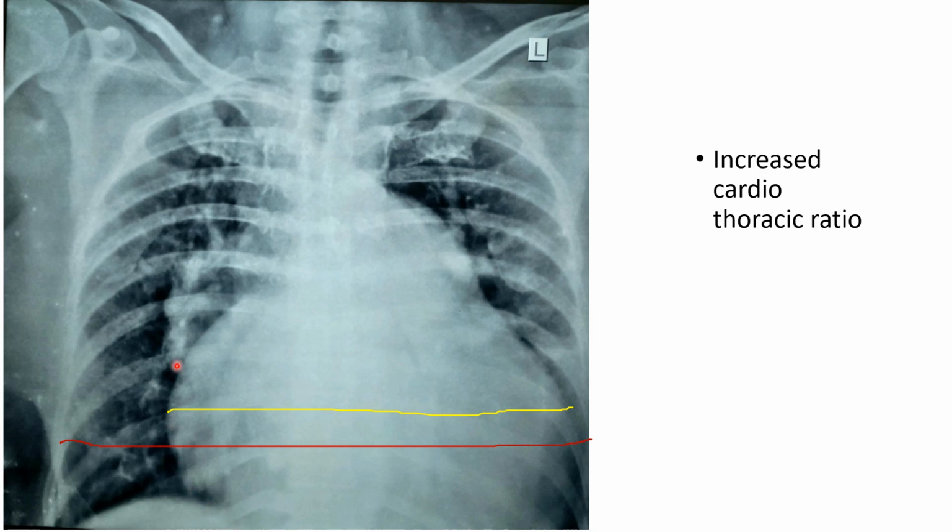And here on the right side, this is the right atrial margin border, and here you are seeing another density which is similar to this border but a little bit medially. This is the left atrial border. So we have this double right heart border, or the double density sign, which is found in the enlargement of the left atrium. That is a common thing in mitral stenosis.